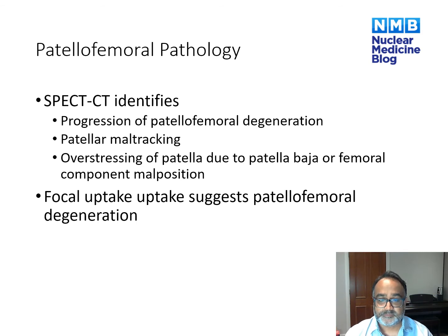Increased uptake in the patella following a joint replacement, even when there hasn't been resurfacing, is quite common. It can indicate patellofemoral joint pathology, but is not always specific. Increased uptake can represent progression of patellofemoral joint degeneration. It could indicate patellar maltracking, and it can be a result of patellar overstressing due to a high or low-lying patella or abnormal femoral component positioning. Focal increased uptake in the patella is suggestive of patellofemoral degeneration, but diffuse uptake is less specific.